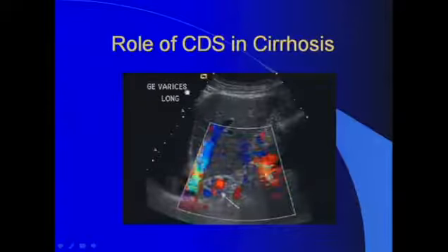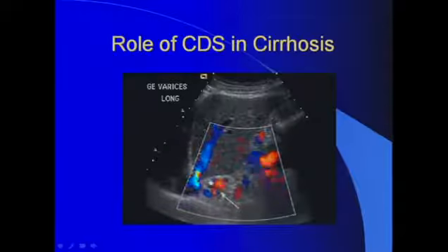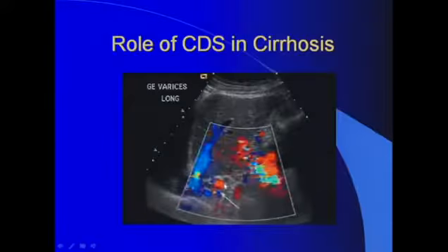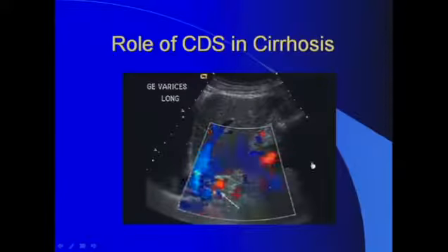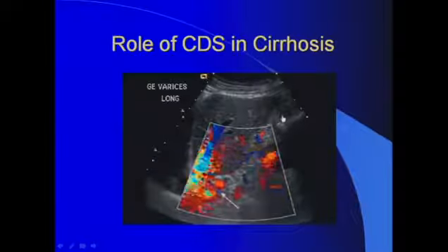Now, this is a nice example showing that if you have the right settings, you can identify esophageal varices with color Doppler as well. Without color Doppler, there's no way you'll be able to identify that. There's no way you're going to tell whether it is present or not, because this will only be identified by color Doppler. So the teaching point again here, a repetition of advice, is that you need to do color Doppler on these patients with liver cirrhosis, even if they just present from the ED or from primary care physicians or even hepatologists for a right upper quadrant ultrasound, not requesting Doppler evaluation.